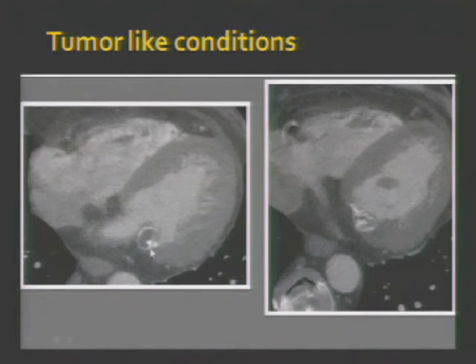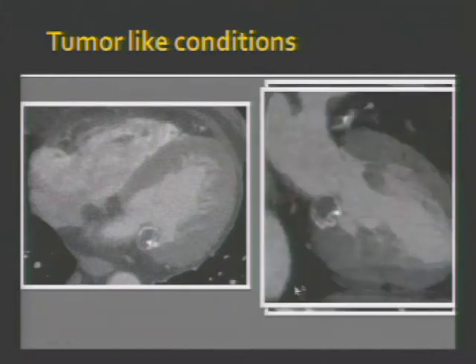So here is what was seen on CT. It has circumferential calcification. The center is a non-enhancing core, and you can see it's related to the posterior leaflet of the mitral valve, and it's seen along the mitral annulus. I'll show you another image. This is a 2-chamber reconstruction. And you can again see this mass, which is kind of irregular, but it is well-defined with circumferential calcification, and the center did not enhance.